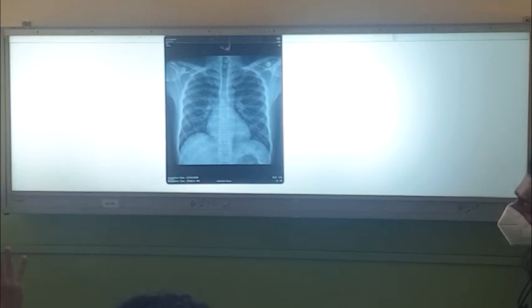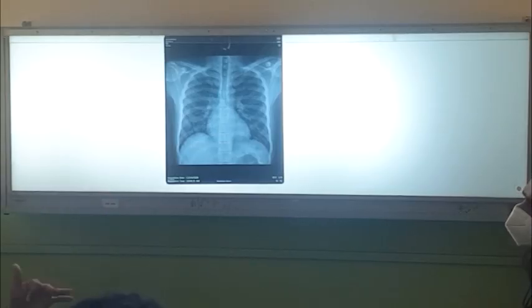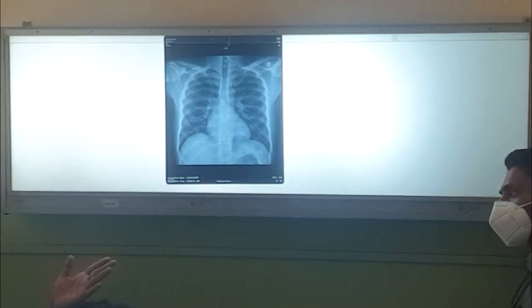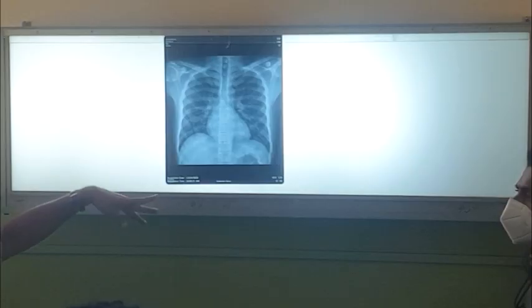So if you see a normal looking X-ray and the patient is ill and hypoxic, there are things that you have to think of. One is acute interstitial lung diseases like acute hypersensitivity pneumonitis. They can have a normal looking X-ray, but the patient is hypoxic. If you do a HRCT, we see a lot of ground glass opacities. The other one is AIP, acute interstitial pneumonia. Another is PCP pneumonia, Pneumocystis carinii pneumonia. So in this patient I suspected Pneumocystis carinii, and HIV came back positive, and we treated with cotrimoxazole and steroids, and he got better.